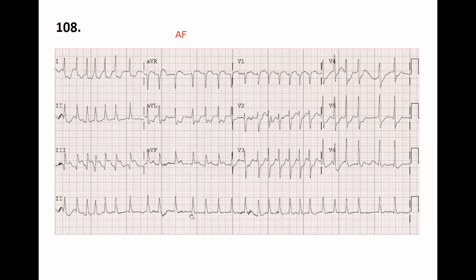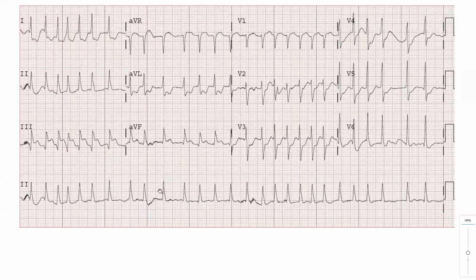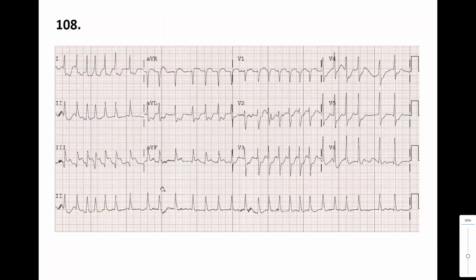Maybe you can see some kind of atrial waves, for example, if I go down here. It's not a clear atrial activation, but I would say that possibly these can be. Morphologically not the same, but it's very fast. It's much faster than 300. So this is why you can say that is AFib, atrial fibrillation, okay. Go back. So that's an AFib. And go on.